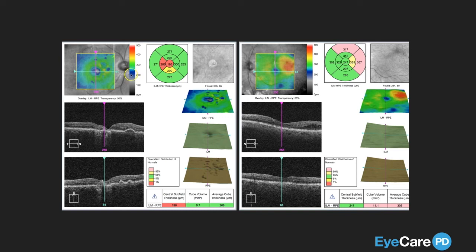What you notice, however, when you look at the statistical map here, is that those areas that are statistically thin are labeled red. Again, the red indicating that it's statistically thin. That red is not from here. This is the colorimetric band that's used to determine the map. But this statistical representation, these background colors, are actually determined by this information down below.